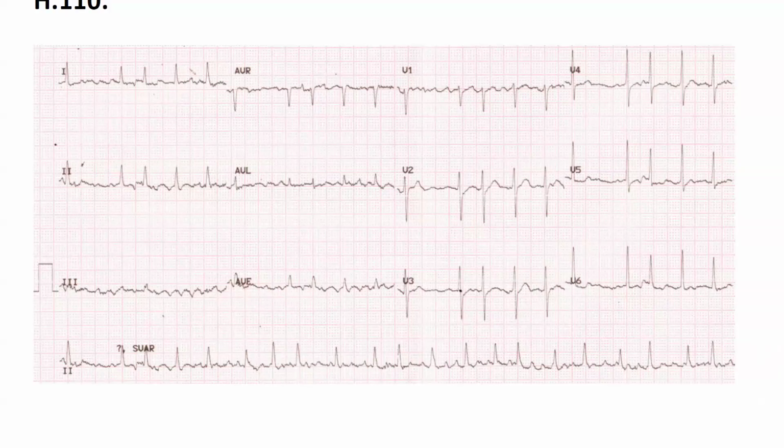Now we can jump into the QRS complex, whether it's wide or not. I think it's narrow. Narrow, okay. Sorry, I'm just writing the notes down as we go. Okay, so we have a narrow QRS.